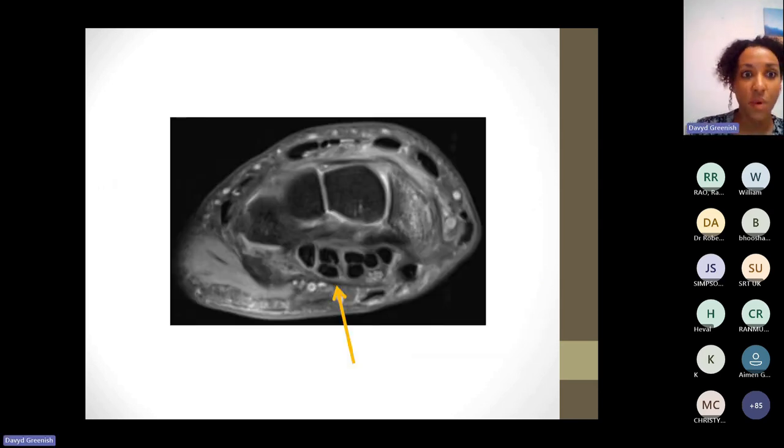Okay, I'm going to move swiftly on to the wrist. Again, it's about just taking a step back and finding out where are we. So this has the classic appearance of the extensor tendons of the wrist. They're nicely spread out around the back of what we can see are the carpal bones.